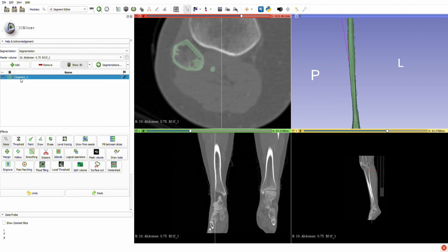The next part will be the cutting guides generation, but that will happen maybe in a few days, because first I will print the mandibular models, both healthy and mirrored, for pre-bending, and then I will take them to the surgeons. We will have a meeting. I will show them both mandibular models, and we'll discuss the fibula and artery, and decide where the osteotomy planes should be in the mandible, and then I will do the generation of the cutting guides.